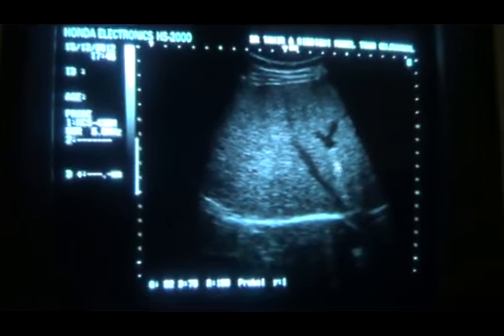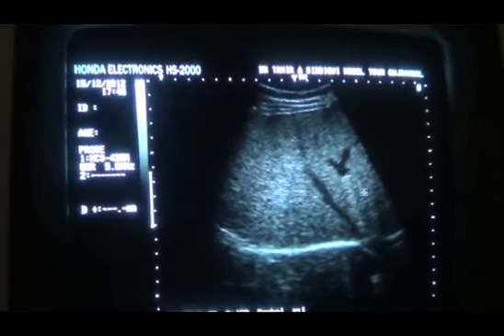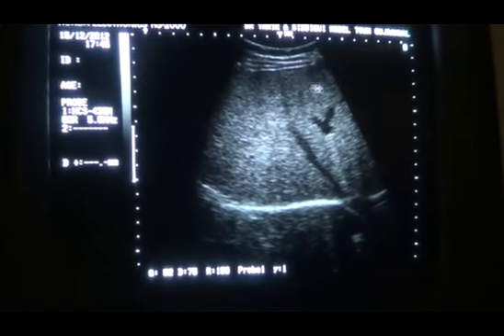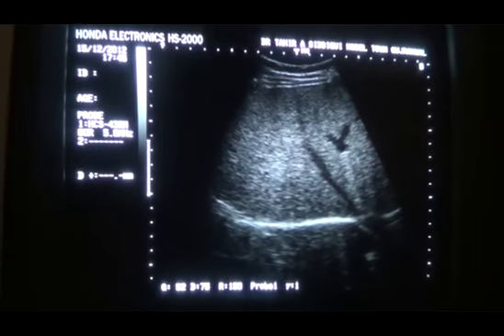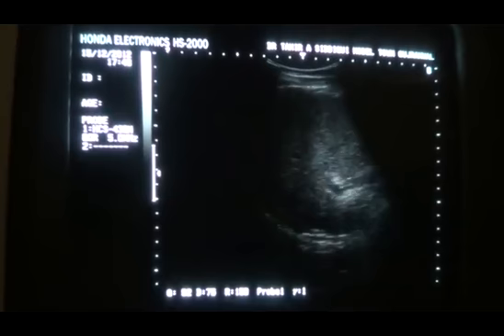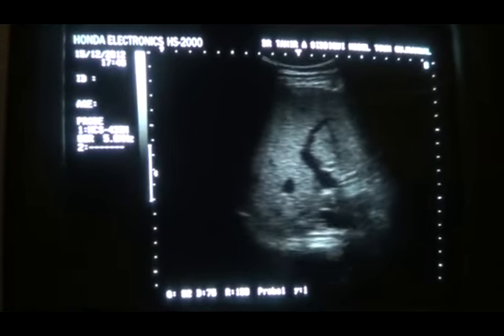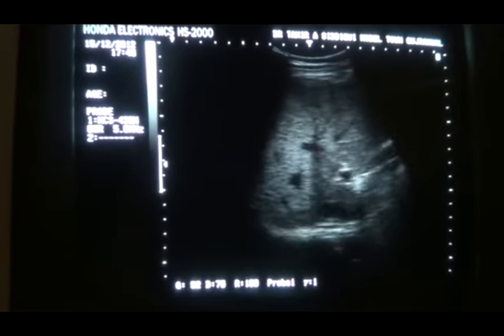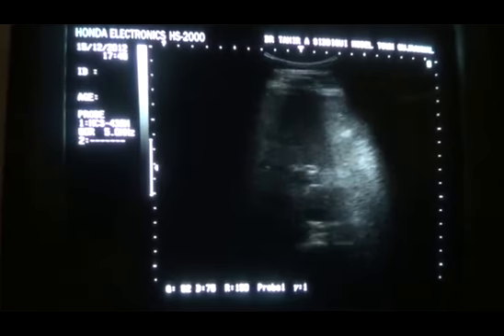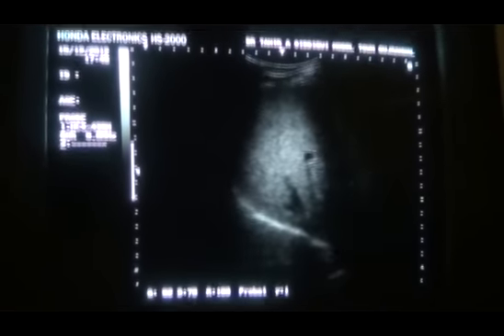Now you can say that, well, this is a fatty liver, that will be enough. But if you want to give further grading, then is it level 1 or level 2 fatty liver? The parameters that make it a level 2 fatty liver are decreased periportal echoes of the portal vein and blurred vessel margins of the hepatic vein.